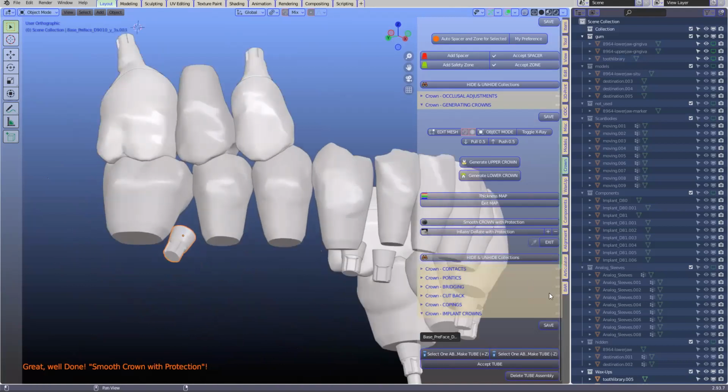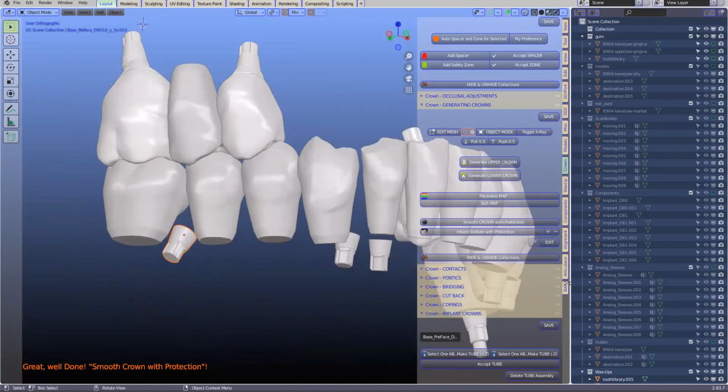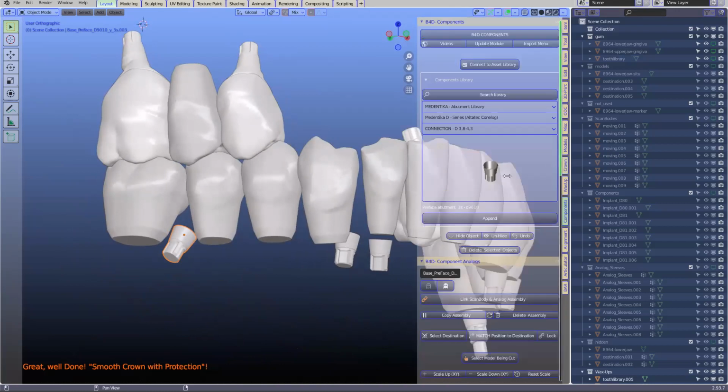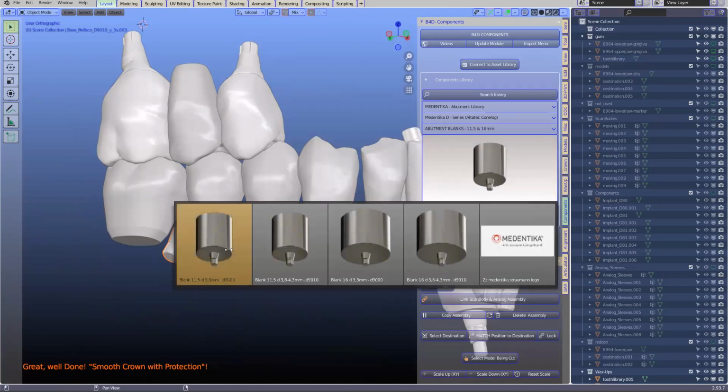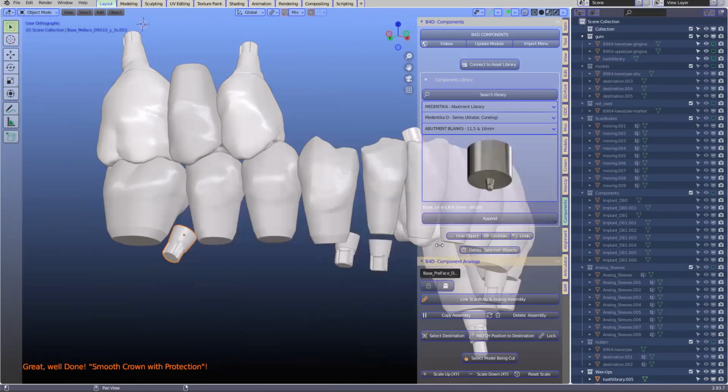But what I can do is, like for this one, for example, we can bring one in just to show what it actually looks like. So we're going to go to the abutment blanks. That's it. That's correct. That's a 3.3. No, I think it's a 3.8. The front ones are 3.3 cam log, I think. The back ones are 3.8, isn't it? That's right.